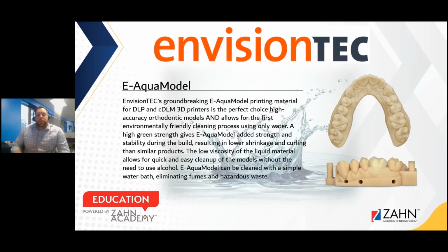So what makes the difference between the resin materials that are available to us on the Envision printer and the E-AquaModel is the way that you're going to be post-processing these models. Now, the E-AquaModel is going to utilize, just like the name infers, water in the post-processing process.